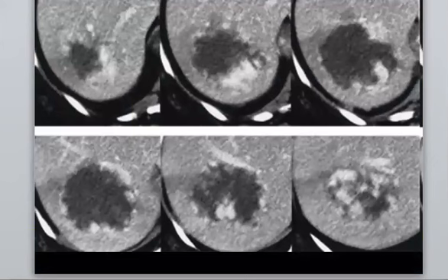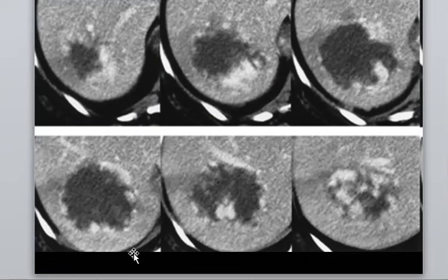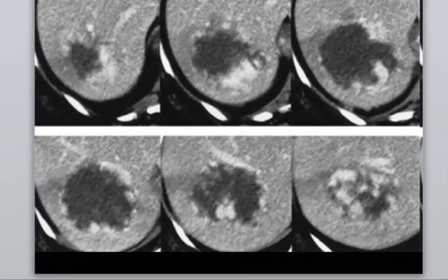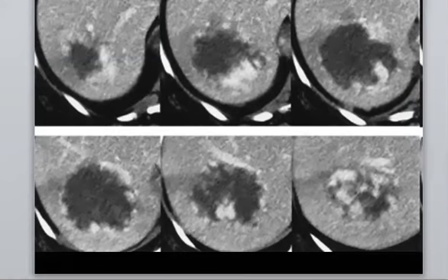If this patient has a known history of cancer, then please don't rush and don't push yourself to go for hemangioma, because we mentioned that metastasis can behave like everything. Metastasis doesn't follow the rule. So if this patient has history of primary cancer, then it's better to put it as differential, or at least to look for the previous image. Maybe if this patient didn't have these lesions and it is newly developed, so maybe it is metastatic.